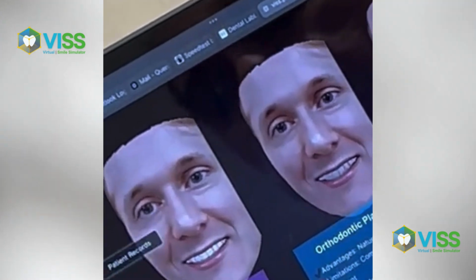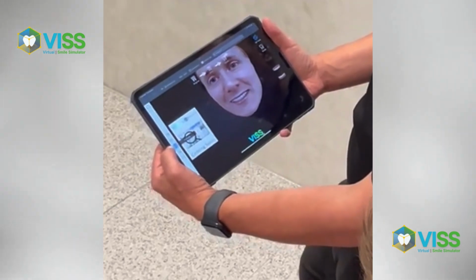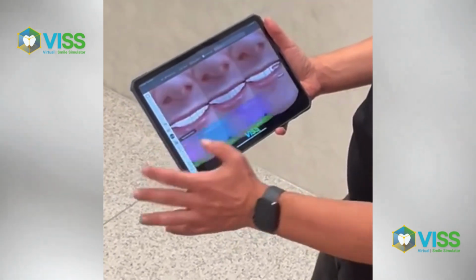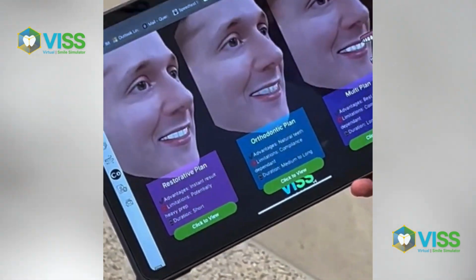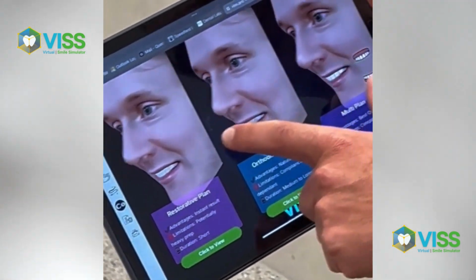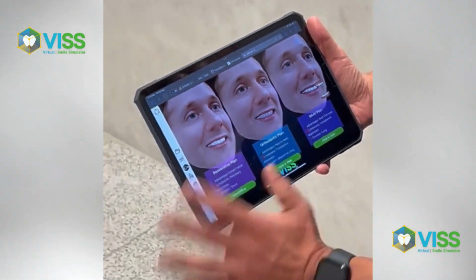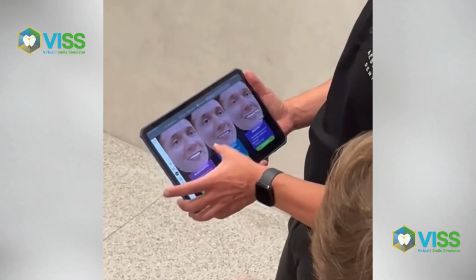So we have all your records stored. Smile Geni is available to access. We also have CodeTreat, where it's the ability to use your radiology for AI diagnostics and treatment planning. And then obviously your smile planning that could be guided with the 3D face on or off. And that's all been created by just a 2D photo of yourself, integrating the STL file or the digital data in place. So this is how we can help you understand the pros and cons of both a restorative solution or an alignment solution or a combination of both.